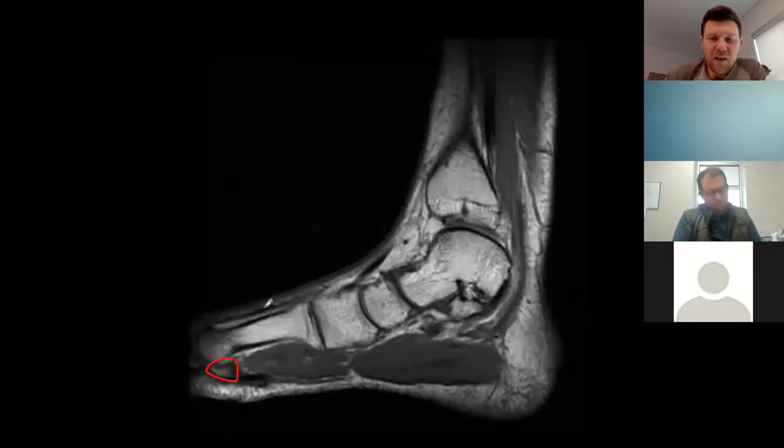So we've identified where we're at, right? Mm-hmm. First metatarsal sesamoid. So if we know we're all the way medial, what's this right here? Sustentaculum tali. Okay, and what ligament would run right here? Spring ligament. Okay. If we're at the sustentaculum and we see this tendon running right there, what would that be underneath? That would be the FHL. Good. And what can we see that's kind of in this zone here?